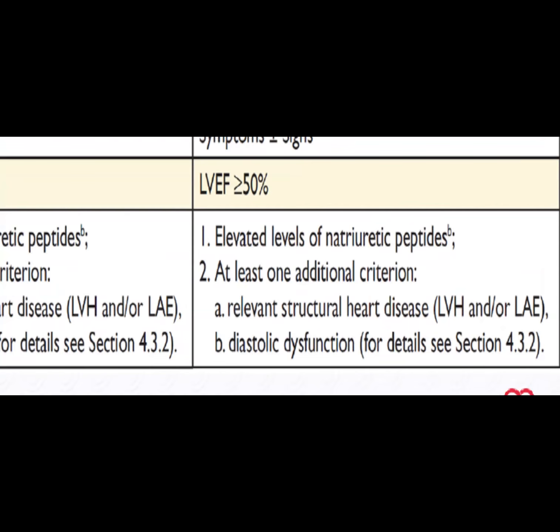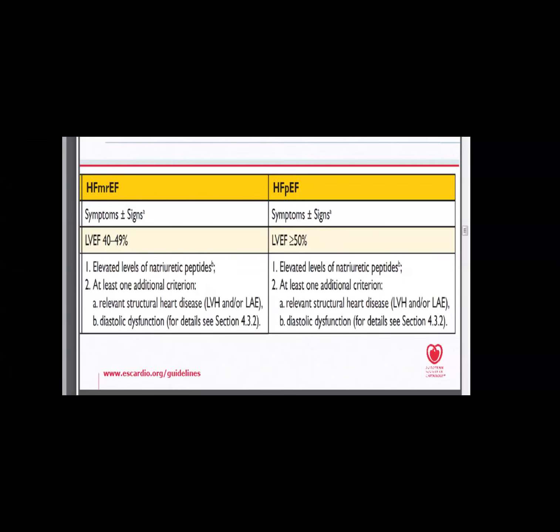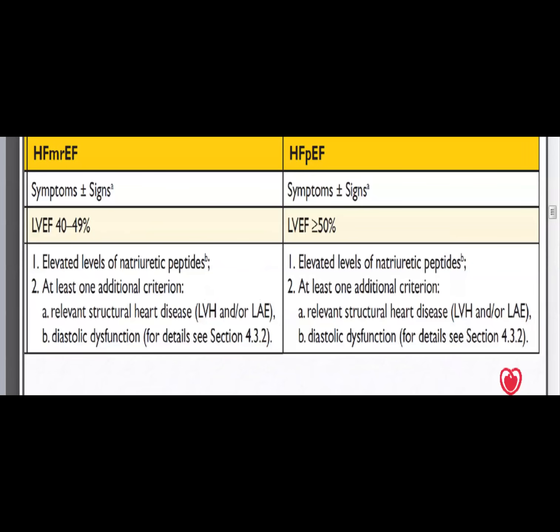So LA enlargement is put in the ingredients upon which you rely to diagnose heart failure across its different categories. So the diastolic dysfunction cannot be completed without LA sizing or LA volume assessment. The same for heart failure. So we have to do LA evaluation by Simpson.